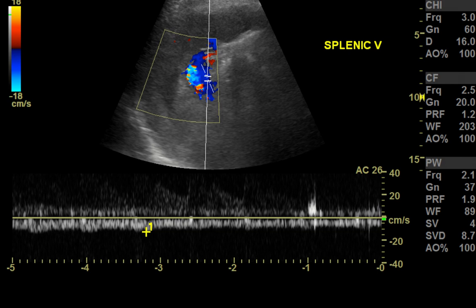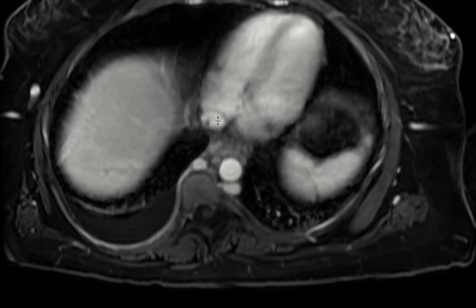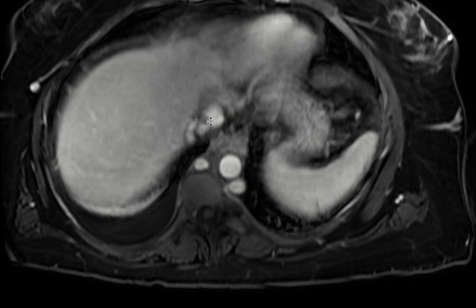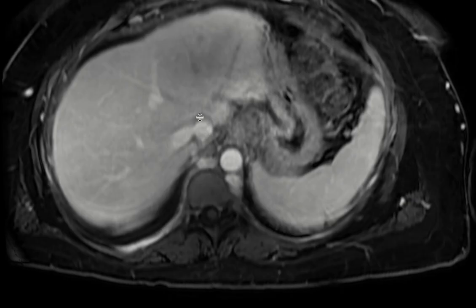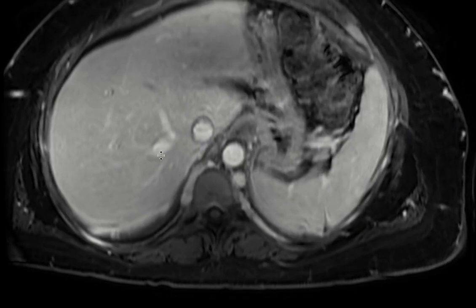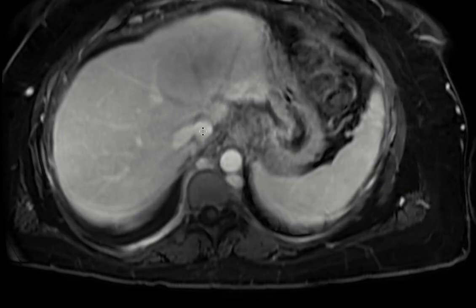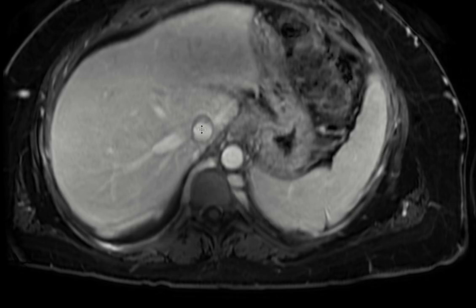This patient went on to get an MRI, and let's take a look here at the portal venous phase on the MRI. We can see here is the IVC coming here, and there's a little filling defect in here, a little web, and we can see that there's quite a lot of narrowing here between the IVC and the hepatic veins. And so here you can see the hepatic veins without contrast within them, this kind of dominant right hepatic vein, but the middle and left hepatic veins are not really showing contrast within them, and it looks like there's pretty severe narrowing at the IVC.